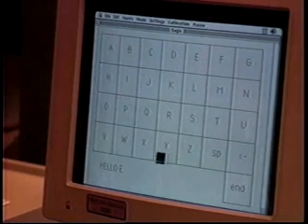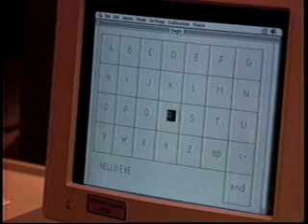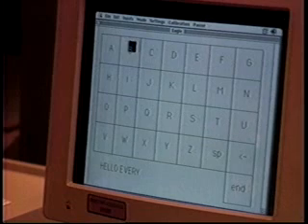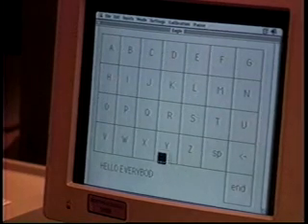Of what use is this system? We see potential uses in many areas. The system could be used with video games. Look to the left and the car you are driving on the screen moves to the left. Look right, it moves right.